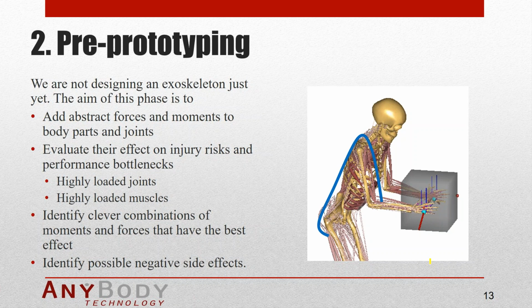So with one actuator, if the moment arms about those different joints are properly tuned, you would be able to relieve many of the joints that this working process is loading. And with AnyBody, of course, you can apply a conceptual device like this, and you can see whether it has the intended effect on the different joints, and you can also see whether you have some side effects.